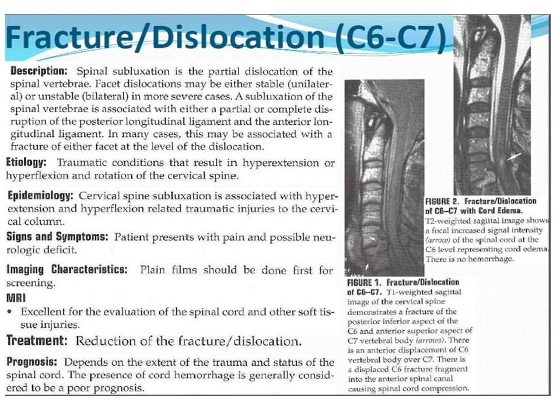So this is an image of a fracture dislocation at C6-7. Subluxation is kind of like the anterolisthesis, spondylolisthesis, but it implies that it's happened under a more acute circumstance. So, like in this case, a traumatic condition. The reason it would happen at the lower cervical spine, you can imagine if your head bent forward and then backwards, you could fracture the vertebra, disrupt the posterior ligaments, and cause damage to the cord itself.